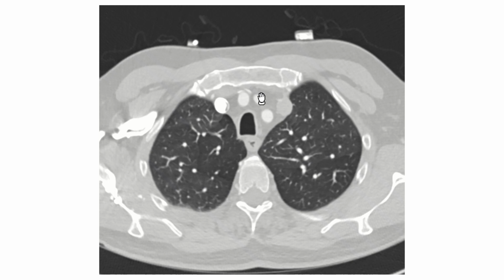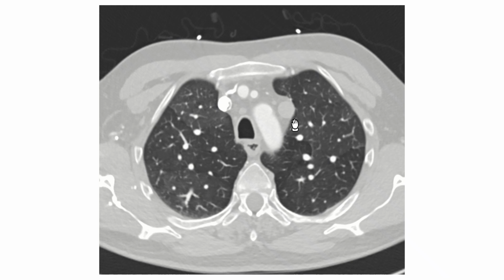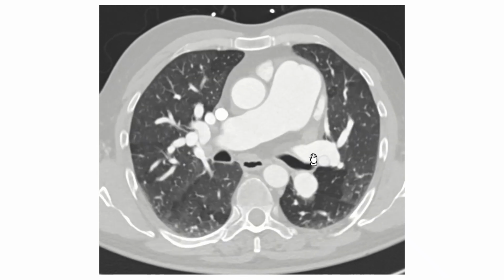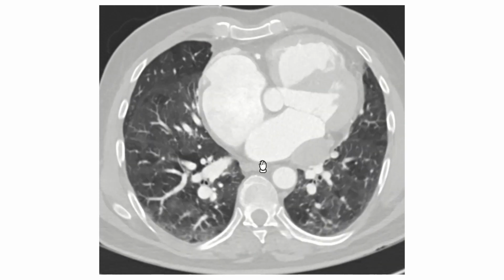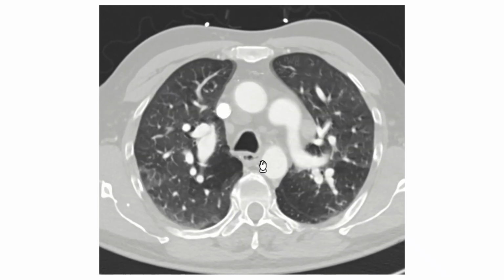Usually in normal anatomy, you will find a bridging vein connecting this side to this side. But in this case, we could see that there is a persistent left-sided superior vena cava. If we follow this left-sided superior vena cava, it goes down all the way along the left side of the mediastinum and drains to the coronary sinus, and from the coronary sinus it drains to the right atrium, which is ballooned or dilated. Also the coronary sinus is dilated, possibly because of the dilatation of the right atrium and the high pressure and volume on the right side at the moment.